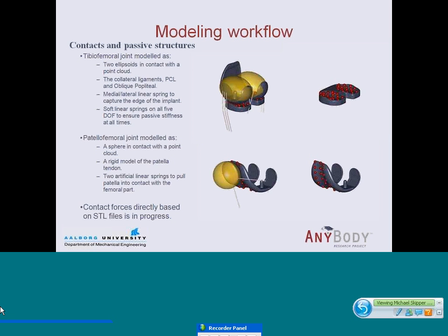When I had that, I needed to construct all the forces. So remember that force-dependent kinematics is all about modeling the joint in terms of the forces. So I needed to come up with the contact forces going on within the implant, and also the passive structures that keep the knee assembled. And the parts I modeled was the tibiofemoral joint, and of course also the patellofemoral joint.